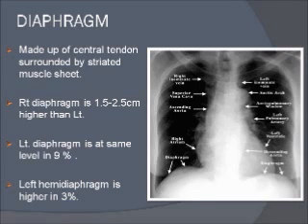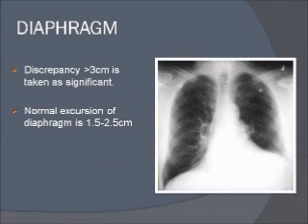Generally in 90% of the cases this is true. But in 9% of the cases, the left diaphragm is at the same level as the right diaphragm. And sometimes, in 1 to 3% of the cases, the left diaphragm may be slightly higher. So generally the right diaphragm is higher, but there is a range.